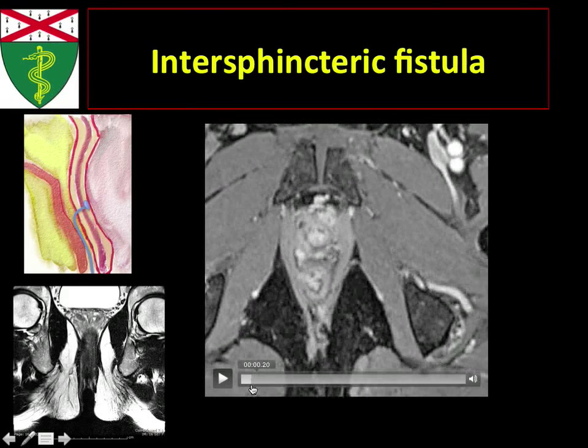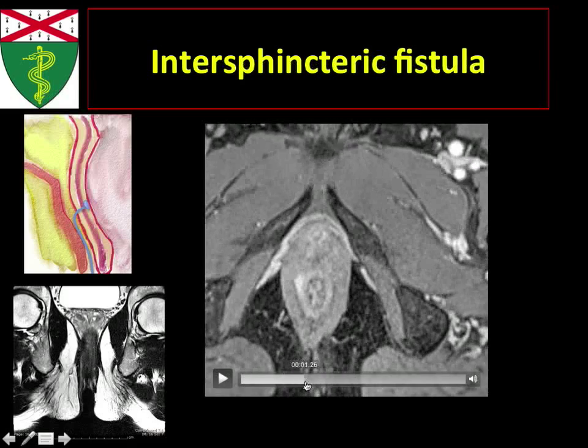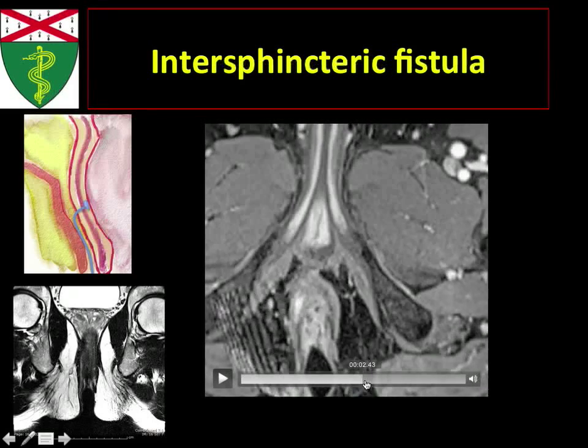This is an intersphincteric fistula. It's arising, in my opinion, from about the 10 o'clock position. This is the external sphincter. That's the internal sphincter. This is the intersphincteric fat. And as you scroll downwards, it is confined to the intersphincteric space. And so it's an intersphincteric fistula.